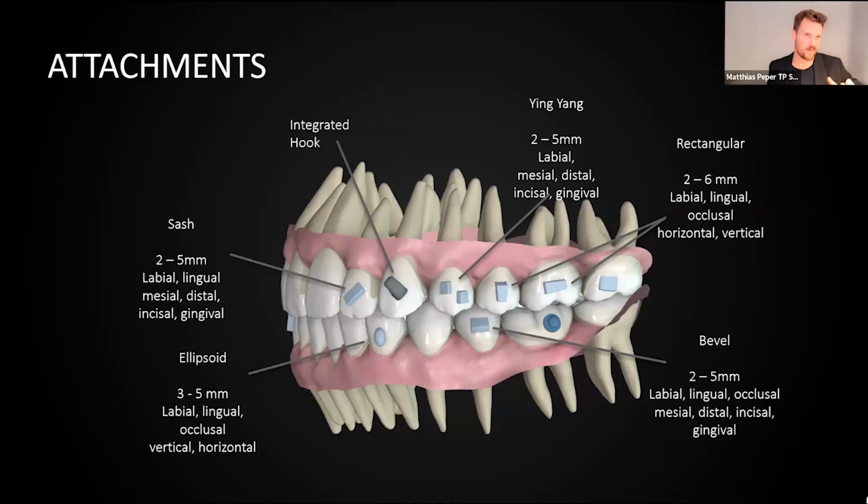We have the integrated hook. We have also seen a kind of integrated hook for Angel and a 360-degree hook from Angel. The integrated hook is a little bit different because it's always combined with an attachment. So we have a perfect anchorage.